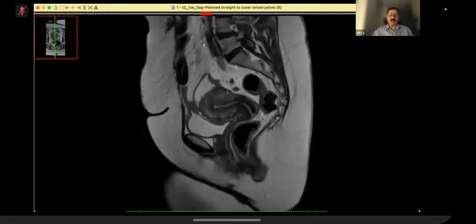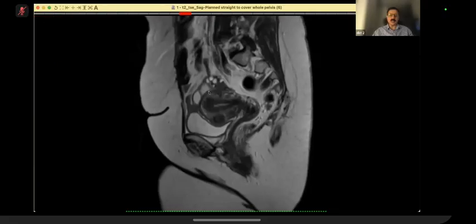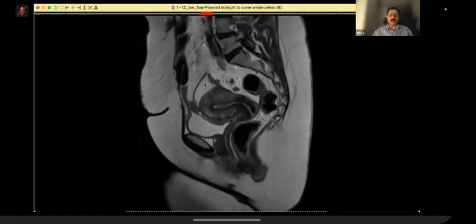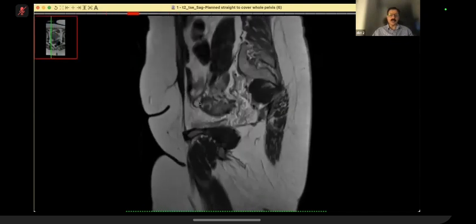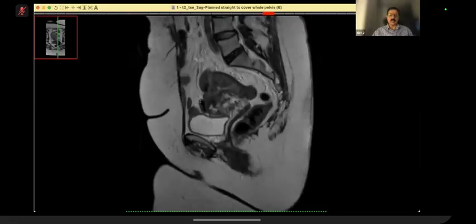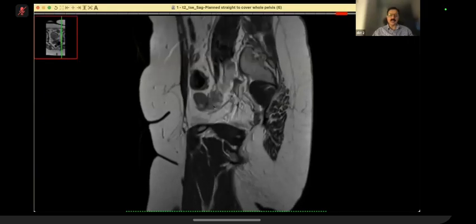Now, with that, if you see this cystic structure, I think you picked it up and you were trying to convince yourself, is it gut or not? Then you lost interest in it. So this cystic structure, we have to see what it is. You can see here it is dilated, and here it becomes less dilated. So what is it? We will see it. On the other side, there is a small cystic structure with again a convoluted type of pattern.